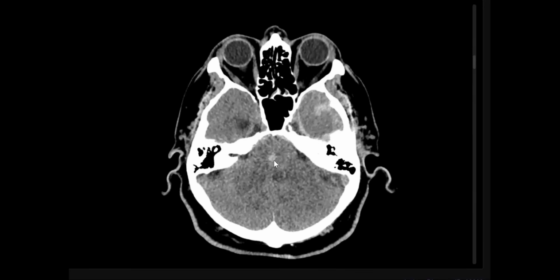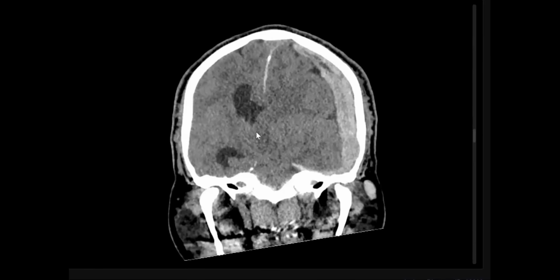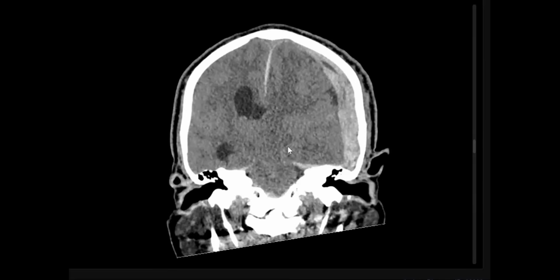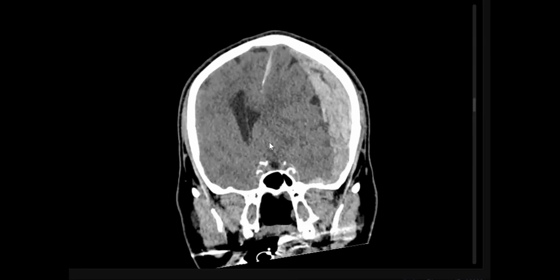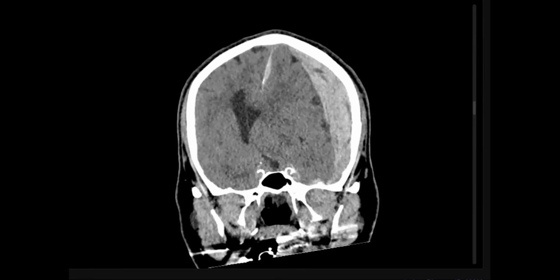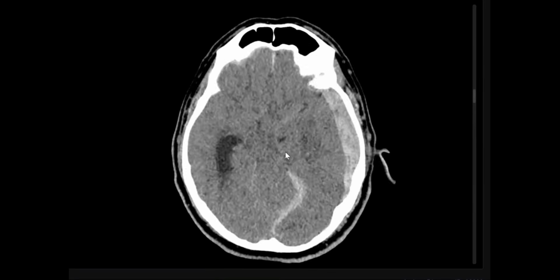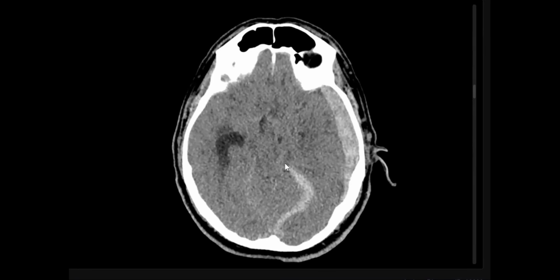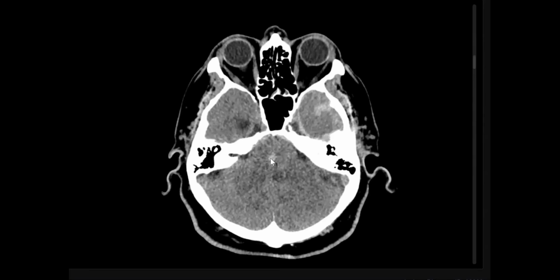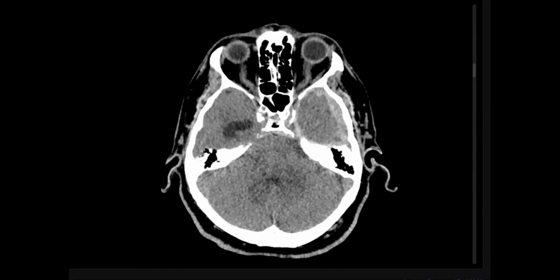Any explanation why Duret hemorrhage happened? No problem. Because when the uncus herniates from the medial temporal lobe, it compresses the vessels running in the perimesencephalic cistern, which is the posterior cerebral and sometimes also basilar artery, and the branches from this, if compressed, cause the Duret hemorrhage.